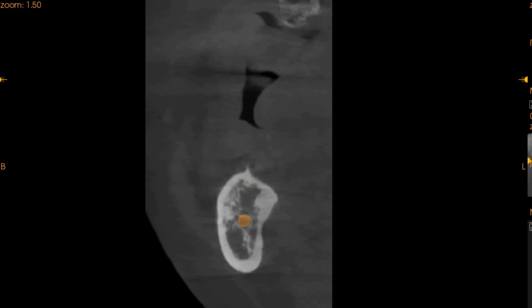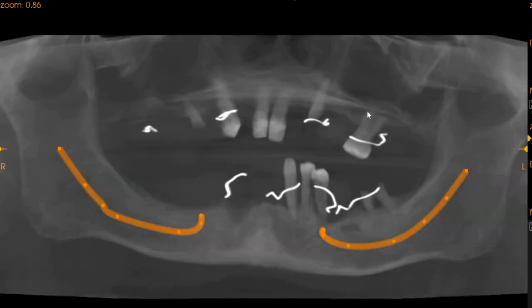To the lower left hand quadrant, this is the canine, yes. The canine on the lower left hand quadrant, as you can see, has significant bone loss, periapical radiolucency. It is definitely periodontally compromised. The lateral incisor region and central incisor region, we've got 4.9 millimeters of ridge width with approximately 10 millimeters of ridge height. This is again very radio opaque and very osteodense bone, and no cancellous bone can be seen.